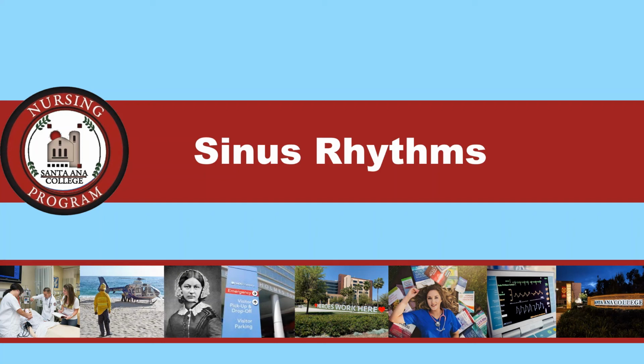In this lecture series, we're going to review the sinus rhythms. Sinus rhythms originate from the SA node, or the sinoatrial node. A normal sinus rhythm rate is 60 to 100 beats per minute, or a normal heart rate. Sinus tachycardia would be greater than 100, and sinus bradycardia would be less than 60.